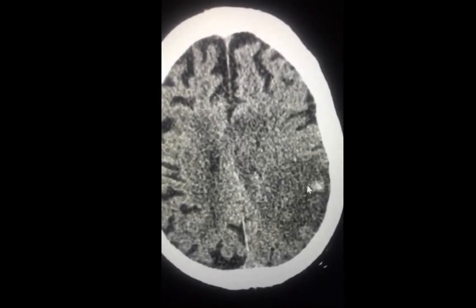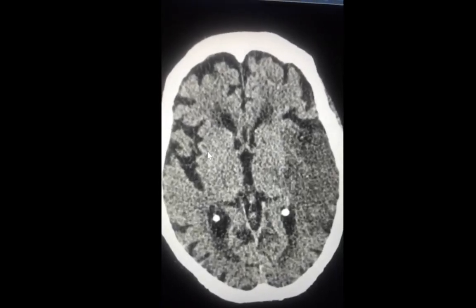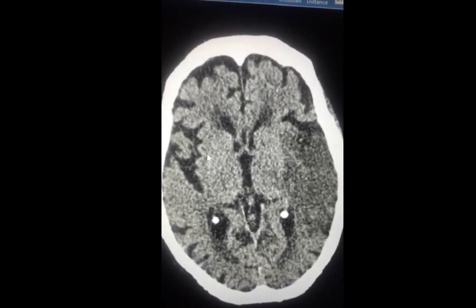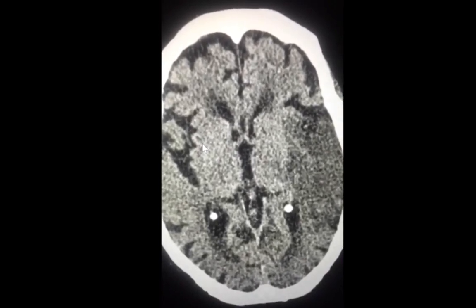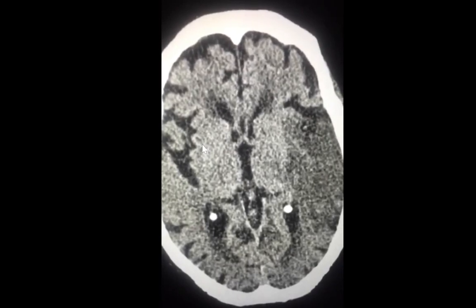which is an anticoagulation contraindication. Several things from this case. The first most important piece of information is that even with acute strokes within the first 6 hours, you might have a normal appearing CT. The thing we learned today is to look for signs of acute infarction on a CT scan, including a hyperdense MCA sign, an insular ribbon sign, and vanishing basal ganglia.